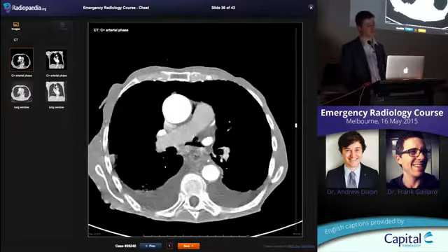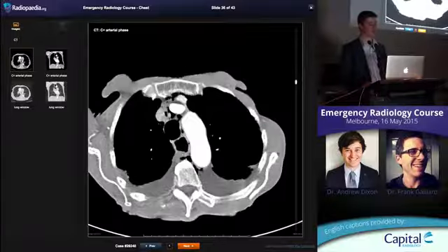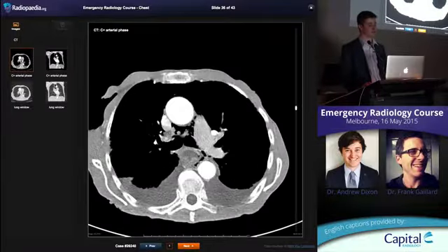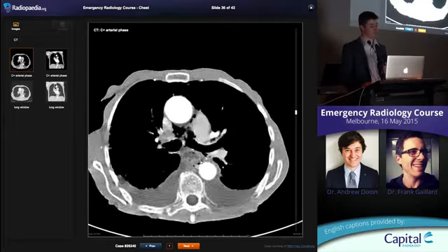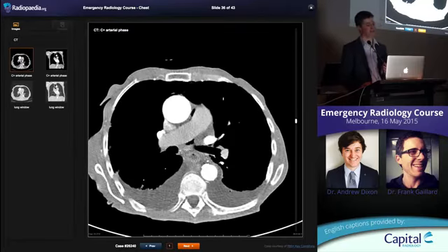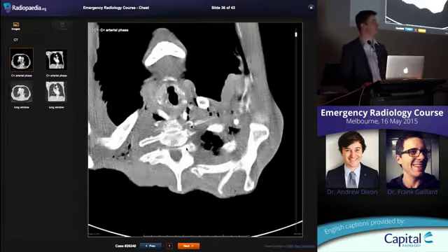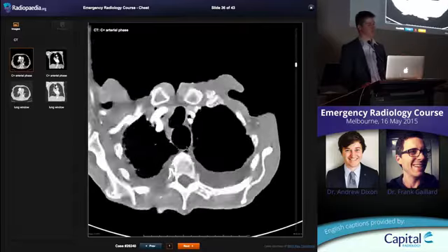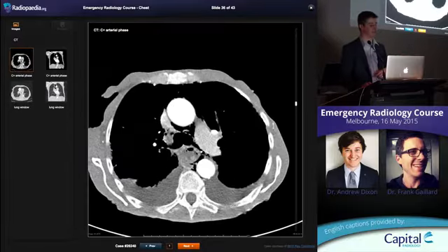If you rupture an esophagus, it is badness. I spoke earlier about the mediastinal fat and being able to see it around all of the structures. Here it's just completely infiltrated with fluid, okay, throughout the mediastinum. You can't make out the edge of the aorta compared to the edge of the esophagus, right? And you've got fluid tracking out into both pleural spaces. Okay, so this pneumomediastinum is due to a ruptured esophagus. The other pneumomediastinum is due to a ruptured airway in a patient with asthma.